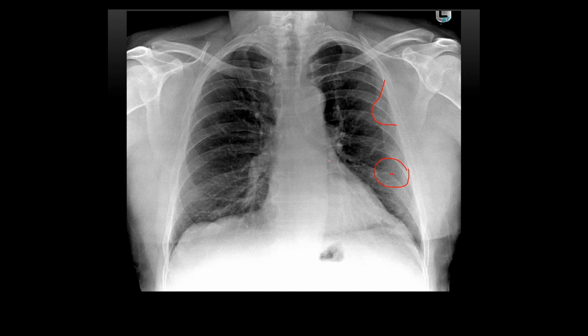So we've sent that for a CT scan to find out what it is. The first is we've done a low dose on that one just to make sure it is definitely a pleural based mass. And then if it is, we'll go on and do staging. Not too sure.